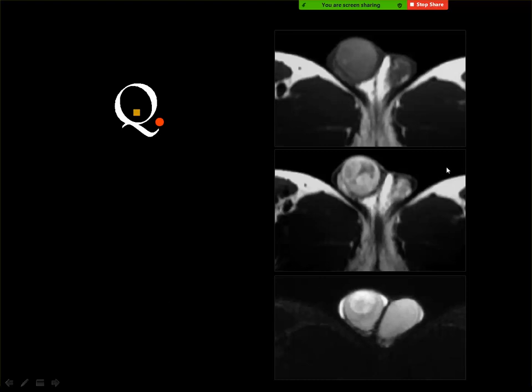This is MRI of the testicles showing a mass in the right testis. It is of low signal in T1 and high signal in T2, with contrast enhancement. It could be, according to the age, seminoma or lymphoma, or germ cell tumor if it is early, younger age.